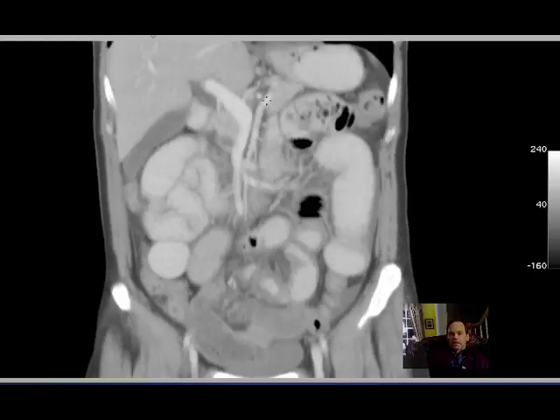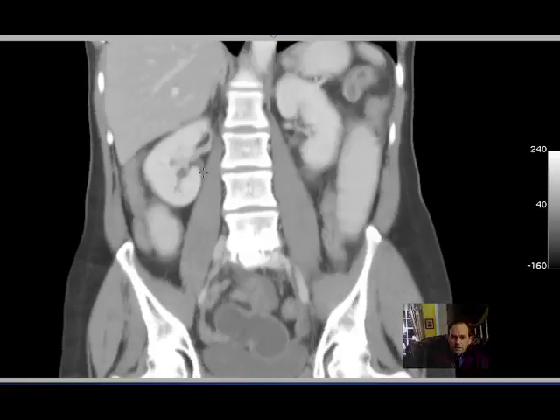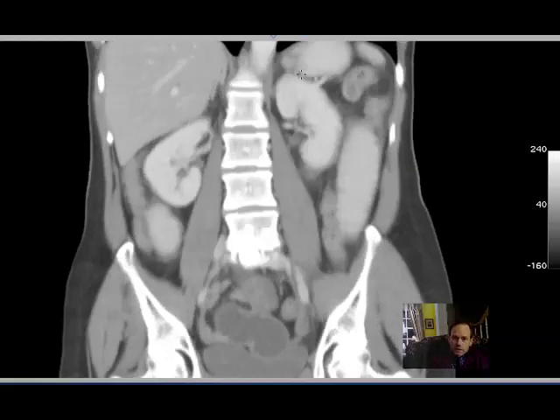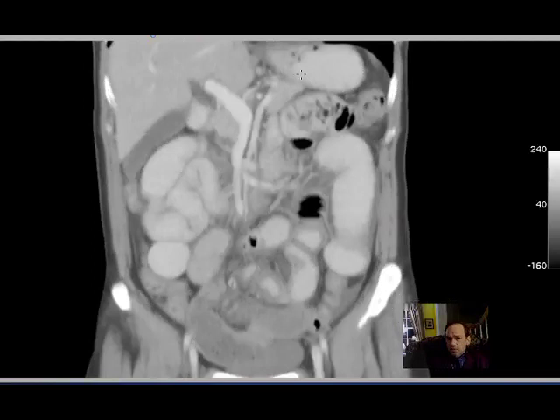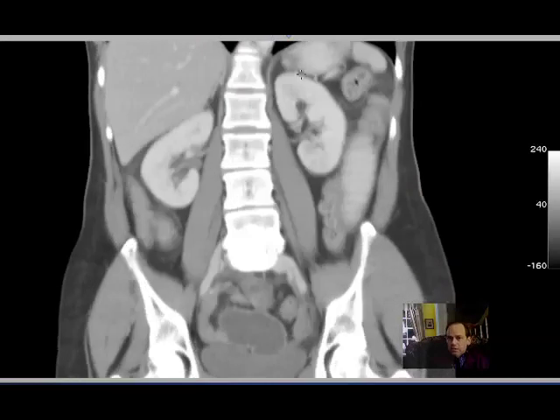All right, let's look again at this. Okay, I'm wondering, where's the splenic vein? Here's portal vein, SMV. Splenic vein should be coming in here, right? What is going on? Where is the splenic vein? All right, there's a spleen. There's the spleen. I mean, I'm right with you guys here. I'm trying to find it. That's pretty small. That's pretty small. That's splenic artery.